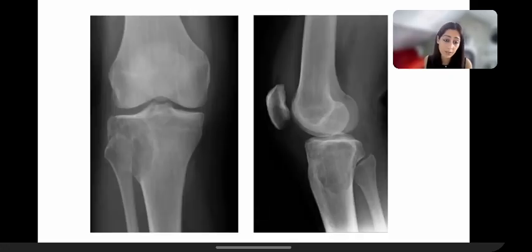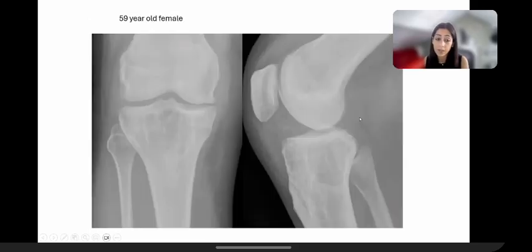So another lesion, 40-year-old female, there is an expansile eccentric lesion with a pathological fracture reaching right up to the subarticular location with a large hemarthrosis. The top of your list of differential diagnosis would be a giant cell tumor, right? Because that just fits with the radiology, age group, and the appearance. Now, this lesion is similar, except it's centric. But other than that, it's exactly similar to what you saw just previously.